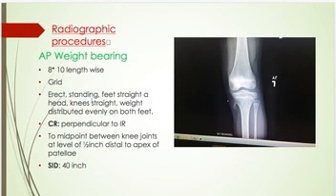As we see here, osteochondroma. For the AP, there is a little rotation because half of the proximal fibula should be superimposed by the tibia.